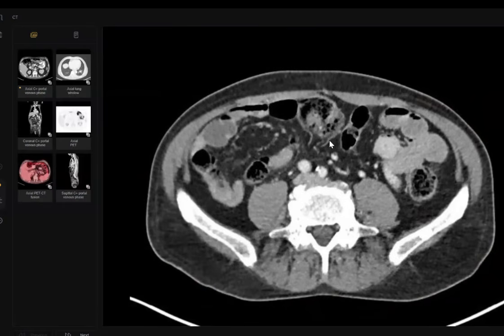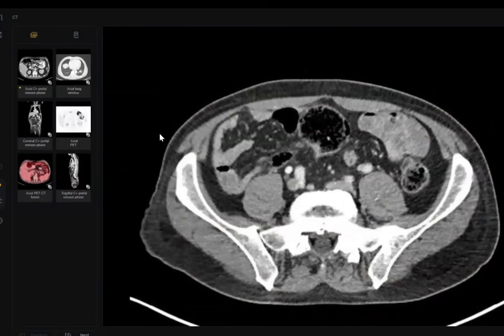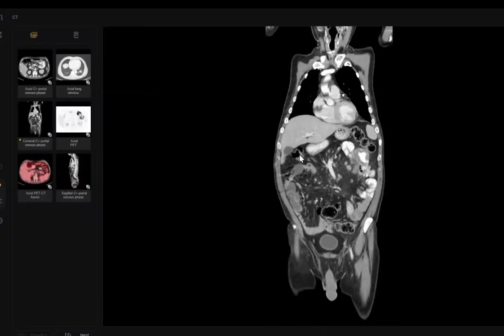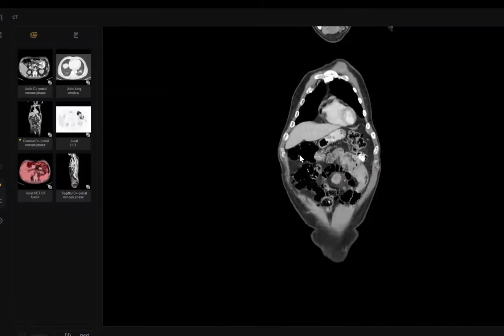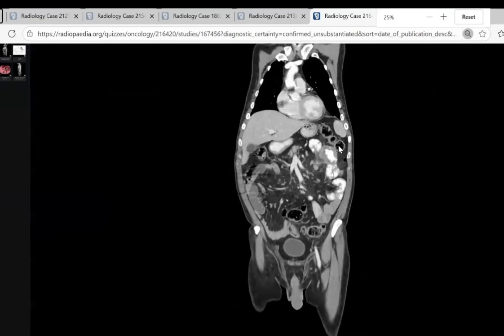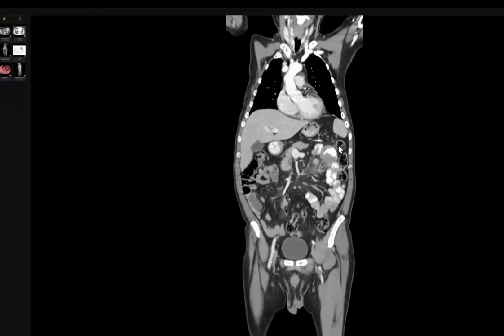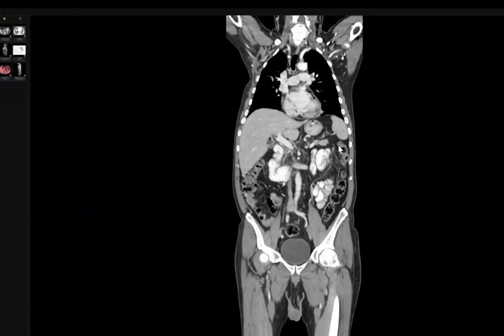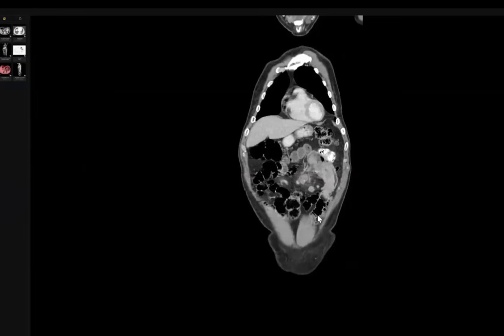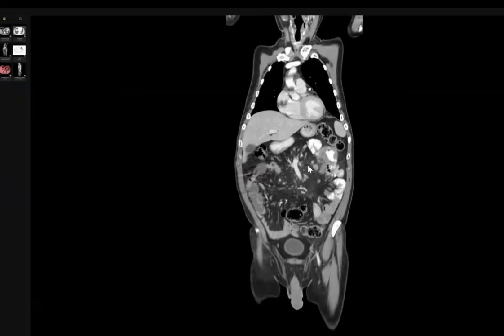Because it causes incomplete obstruction. How could, doctor, we differentiate between complete obstruction and incomplete? Look after and before. Look here after, or distal to the mass, there is normal passage of contrast. See? And air, there is air here. Okay? There is air. So it is a non-complete, partial obstruction. So this is not an emergency.